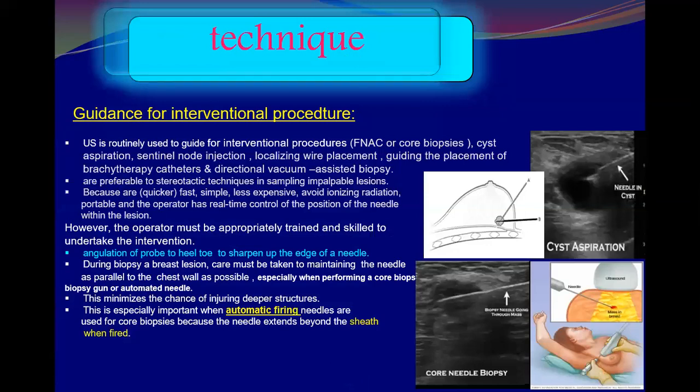Ultrasound, as you know, is the best modality, or routinely used modality, for interventional procedures of the breast: FNAC or core biopsy, cyst aspiration, sentinel node injection, localization or wire placement, guidance for placement of brachytherapy catheters, directional vacuum assisted biopsy, and so forth.